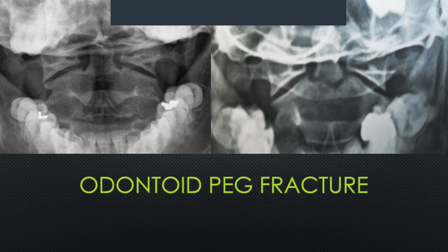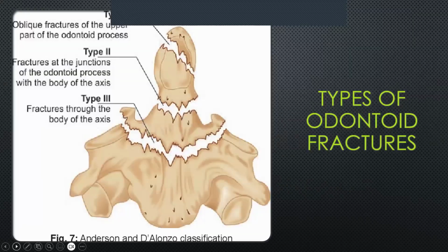At least you can do a trauma series. The open mouth view is quite easy to do while your patient is lying flat. Your C-spine is a bit more difficult because it does sometimes reflect steps that are not really there, and a lot of things can happen because of the patient's positioning. But the open mouth is one that you can really see quite easily, even if your patient is immobilized.